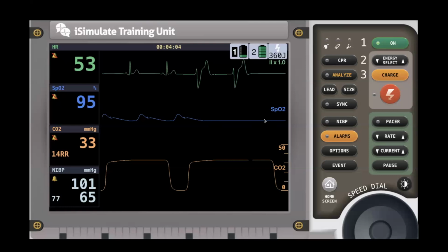So that's a quick review on EKG Basics 2.0 for the EMT EMR for when you hook up the patient and wonder what's going on. So that's a basic review of what's going on and what normal or good should be.